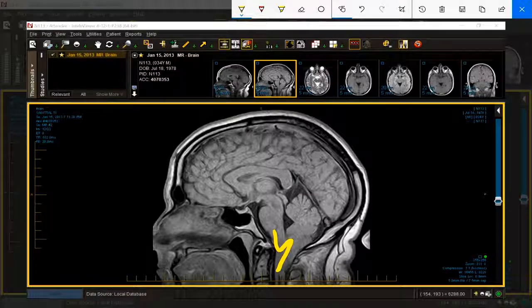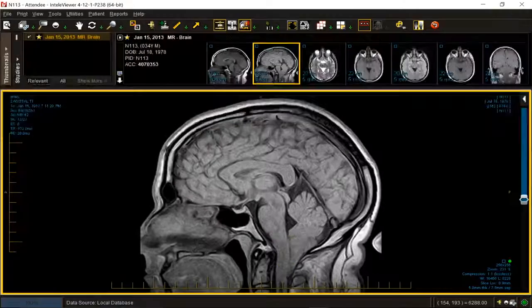There is no dragging down of the medullary clava. The little bump that lives here is often pulled downwards. And so the diagnosis of Chiari malformation, in this case, can be made. Now, when couldn't it be made?